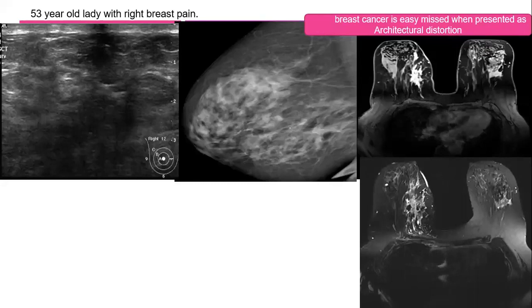Then we proceeded to MRI, and if you look at this T2, it demonstrates distortion and hyperintensity, an edematous breast extending from the prepectoral region down to the nipple, with ducts, you see here, in a segmental distribution and adjacent skin thickening, even here.